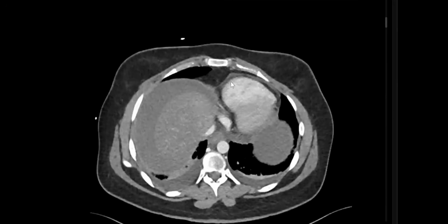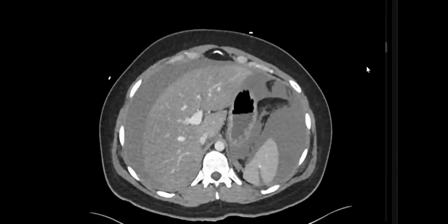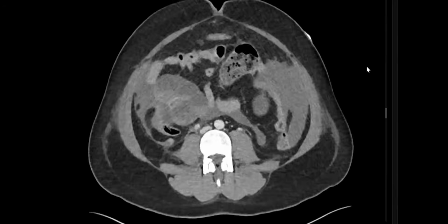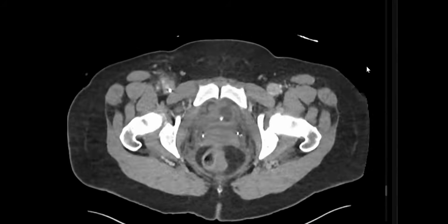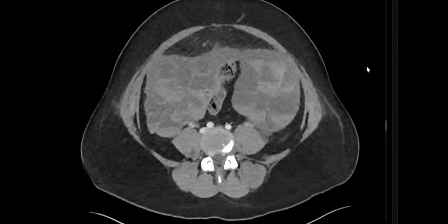Okay, you can scroll. I scroll? Yes. Okay, it's not scrolling. One minute. Go down, scrolling down directly. Okay, there is ascites, pleural effusion. As I go down in the pelvis, I can see massively enlarged ovaries. Good. Excuse me for the jumping, please. No problem. It's my internet.